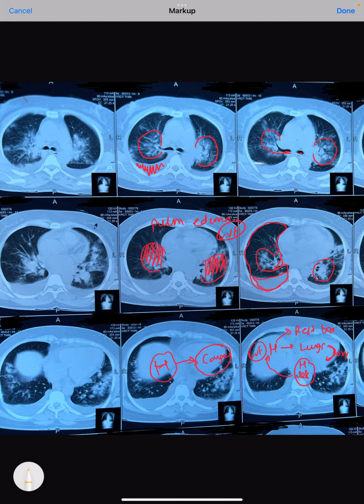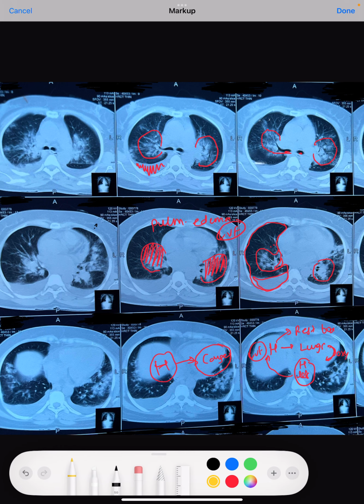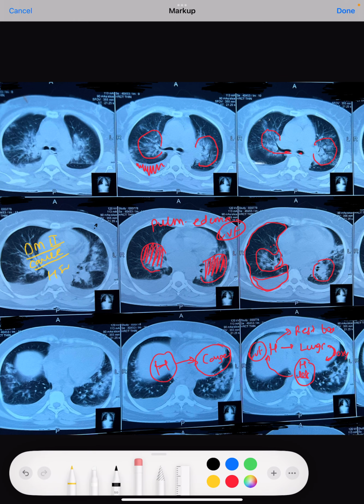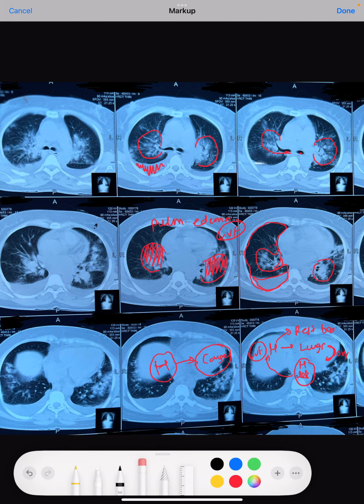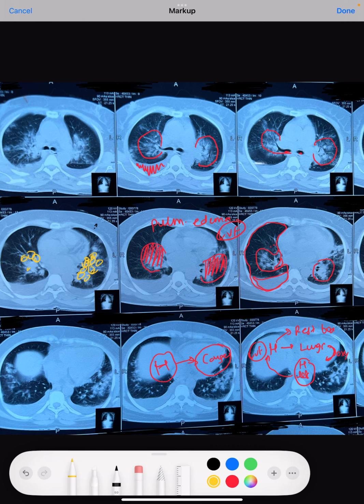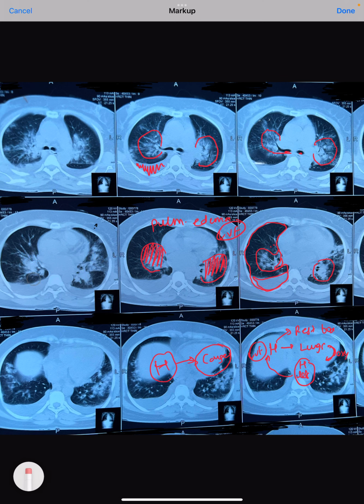We must know Pneumocystis carinii is seen in immunocompromised patients, especially those who are uncontrolled diabetic, cancer patients, or very commonly HIV patients. So we must know PCP is an infection. What we see is fluffy shadows, cotton wool-like fluffy shadows in the perihilar region, as well as in the periphery also. If there is PCP, the chances of pleural effusion will be much lesser, because it is more of an infection.